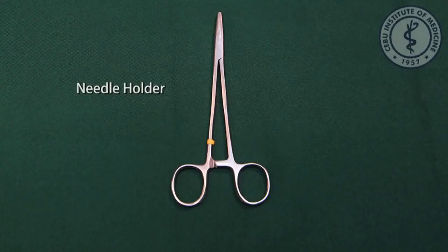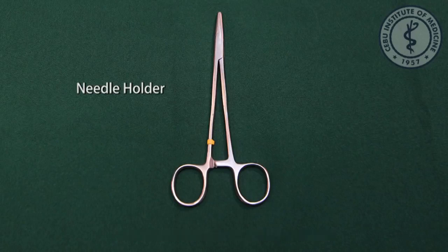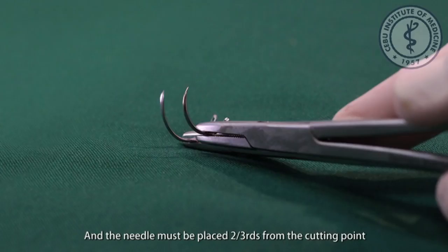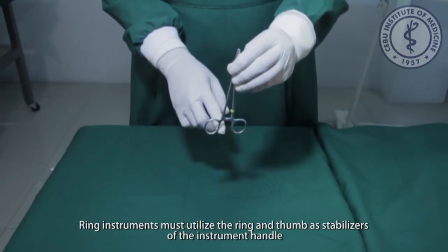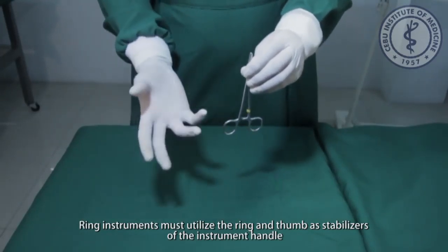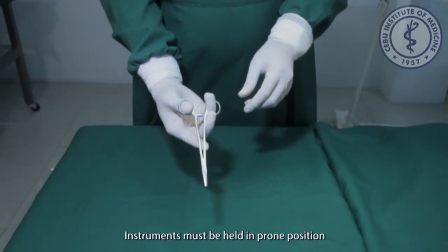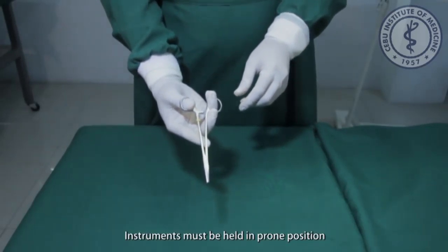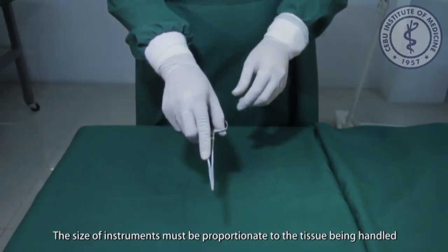Needle holder must be held in a tripod or palming technique, and the needle must be placed 2/3 from the cutting point. Handling of surgical instruments. General guidelines. Ring instruments must utilize the ring finger and thumb as stabilizers of the instrument handle. Instruments must be held in prone position. The size of instruments must be proportionate to the tissue being handled.